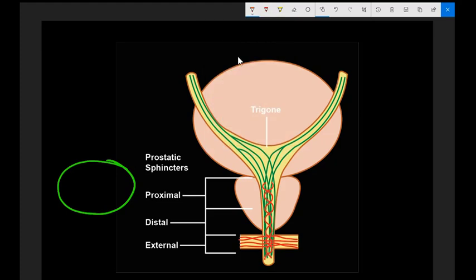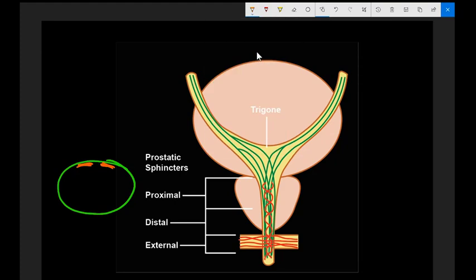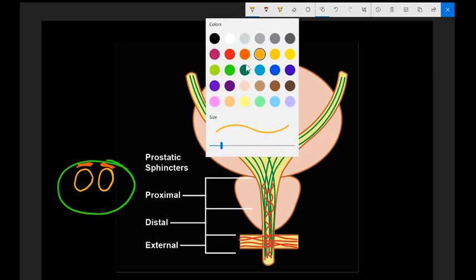So in the front of the gland, we've got the left and right AS, or anterior fibromuscular stroma. Then we've got the transitional zone behind that. Let's make the transitional zone a little more posterior. And we're going to have a TZA and a TZP on each side, so you can divide that in half. And you're going to have the urethra and the periurethral tissue.